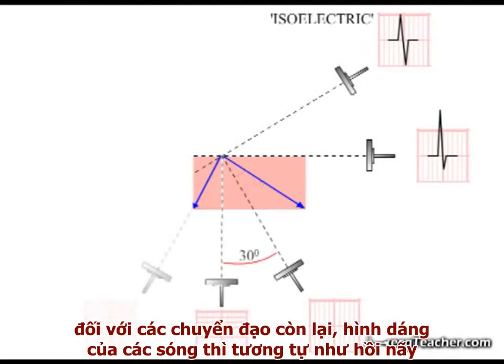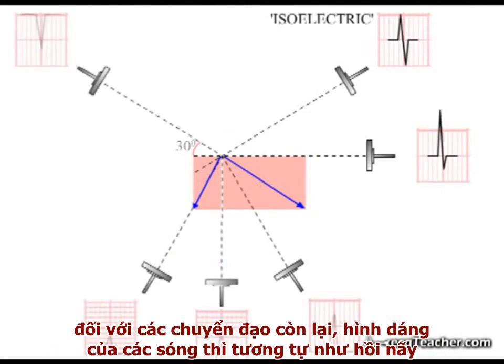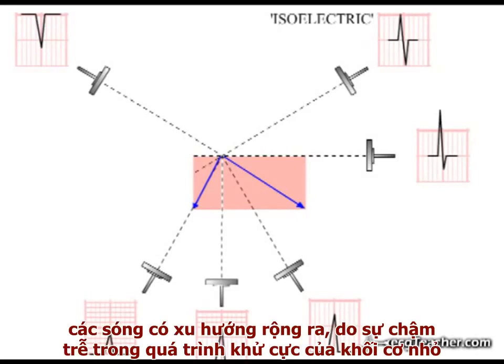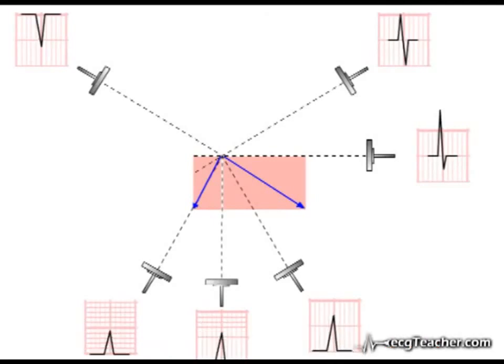In this model, the morphology of the readouts in the remaining leads remains very similar to before. While the model complexes enclose the same area on the ECG paper, a reflection of the total voltages generated, they are widened due to the delay in the signal from the smaller section.